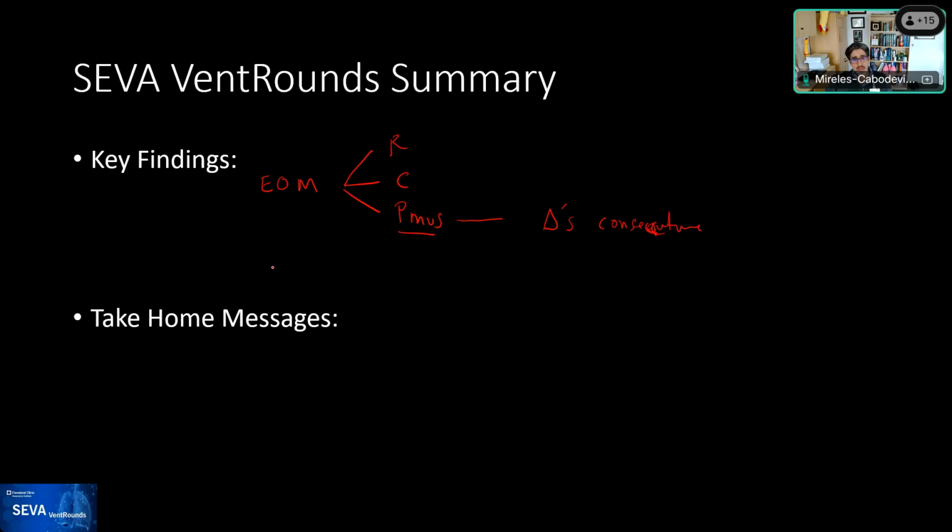The other one we talked about was early trigger. We recognized early trigger on the ventilator. The variant in this case is reverse trigger, and what we did for this patient was to decrease the respiratory rate, just for the sake of time.